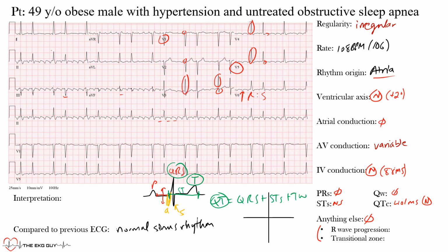Okay. So because you have that big jump, I would be hesitant to call this normal per se, okay? But it's hard because you have these complexes that almost look a little different here, okay? And look at the amplitude in each one. So I would almost question this, you know, and again, we could say normal, but I would question if there's abnormal. Now, the reason I'm not going to be so definite on this is because these precordial leads, these are the leads that are placed on the chest. And it really depends on how they're placed, and there's no perfect science to it, so it's hard to really rely on that. And when you see that big increase from V2 to V3, that may question that you have maybe poor anterior forces or septal forces here in V1 and V2. So that's just something to keep in mind. But otherwise, it's hard to really tell. But that's just kind of the thought process behind that.